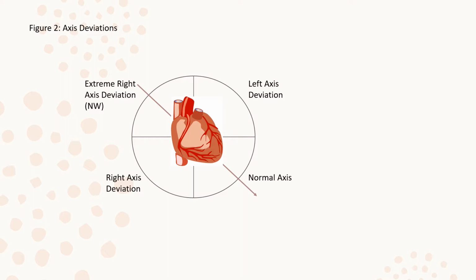So it's just a matter of trying to get some commonality so that we're looking at the same stuff. Okay, so this southeast corner is our normal axis. And remember that a circle forms 360 degrees. So there's 90 degrees in each one of these regions, if you would call them that.